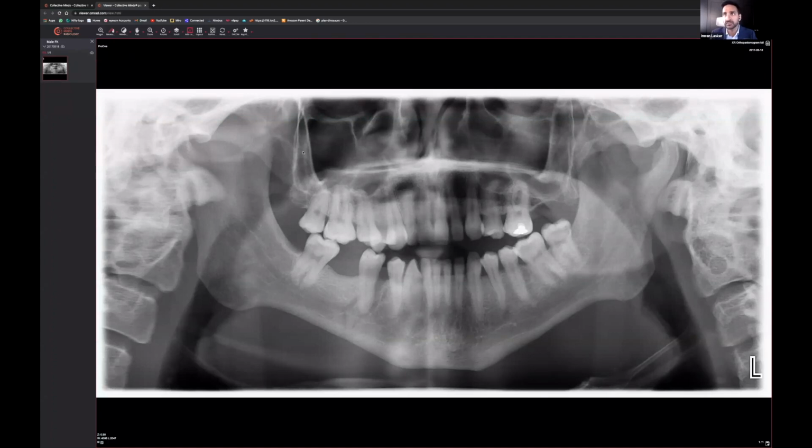It's very important we have a look at everywhere else, and the way to do that is to genuinely take your time and go through it. Look closely, and draw all the way around, just to make sure there are no other fractures anywhere else. In this particular X-ray, you don't have the usual 2 fractures in 2 different places. You've got one fracture that extends all the way through to the root and around the root of the fourth tooth on the left lower mandible.